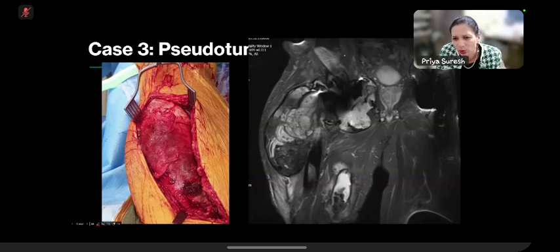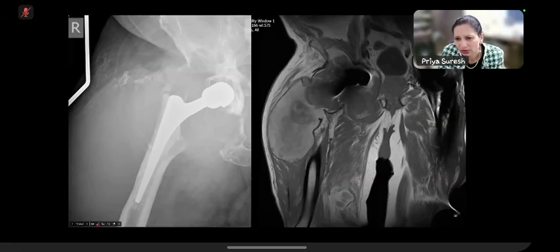Okay, and what is your clue? Your clue is the fact that you have previous radiographs that you can see, and the changes have started in 2012. The next clue is the low signal intensity rim around it. It is heterogeneous, and it's not obeying any plane, because it just goes through wherever it can find its way, and then it starts destroying the adjacent bone.